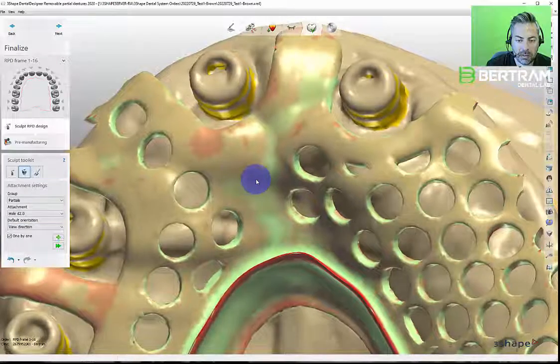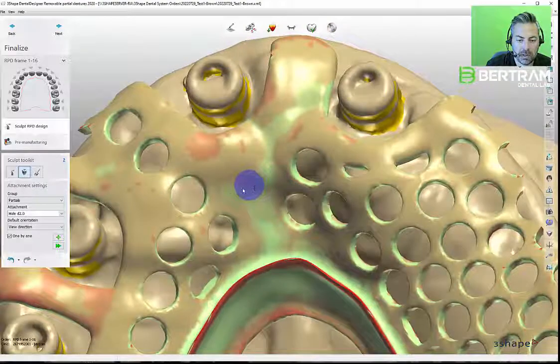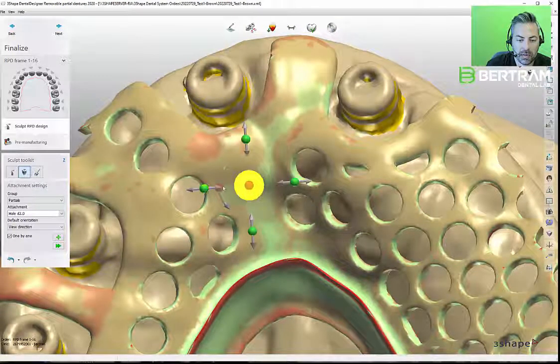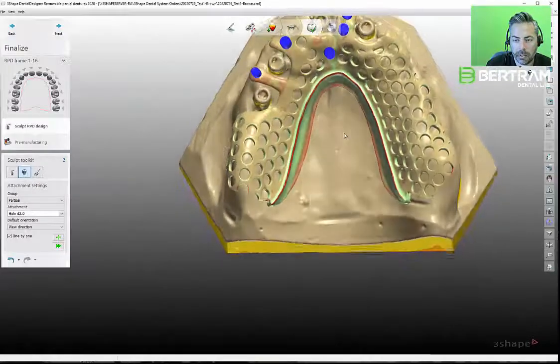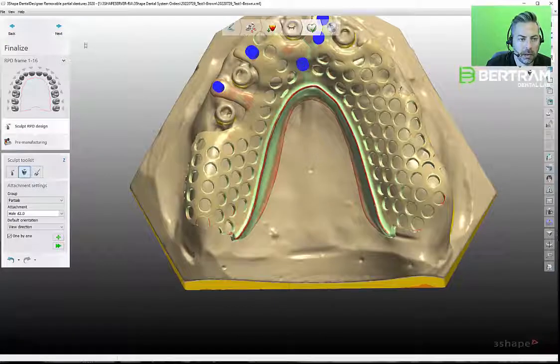The nice thing with this particular one is you can adjust the size, because that's a 2mm hole and this is a 3mm hole. If I want to drag this a little bit, you can set these up as defaults too. I'm going to try to match that a little more closely. There, looks pretty good. I'm going to go with that.